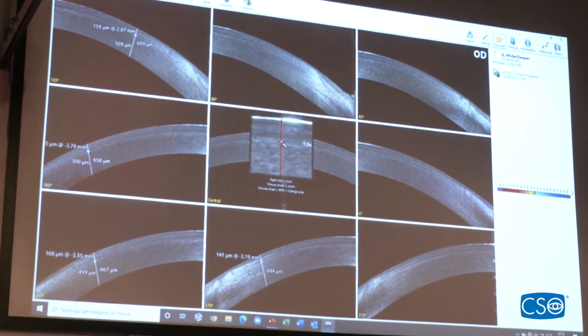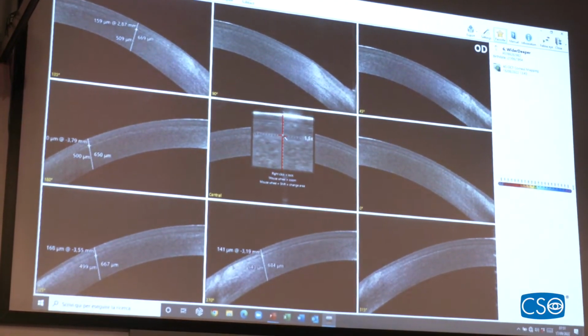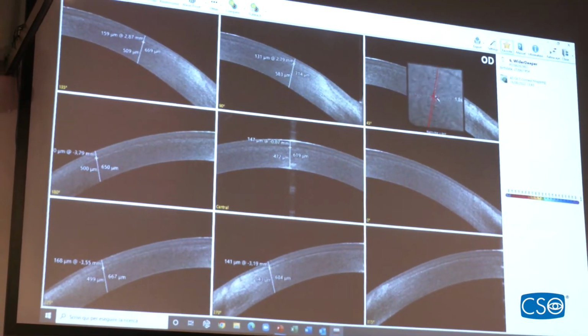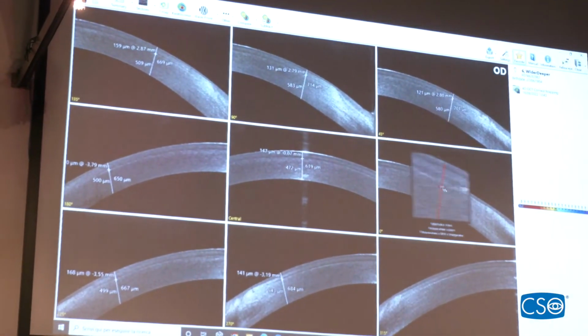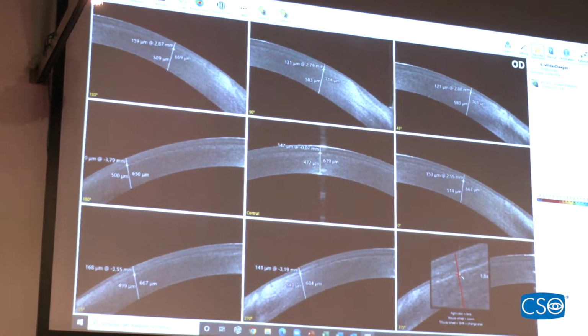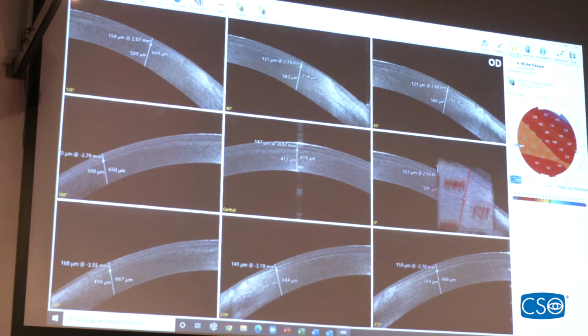There. Obviously, you move a few microns. This is not exact, it's rough. But it's good to have a rough guide quickly. If I had to do an insight, there you go, there's the map.